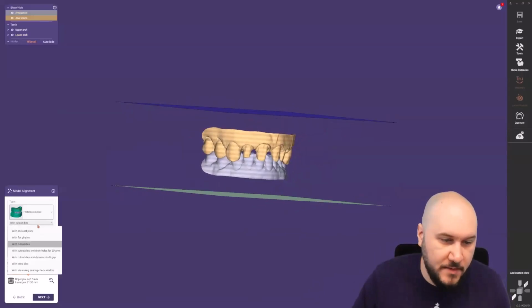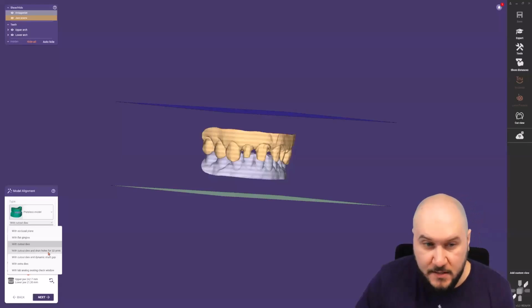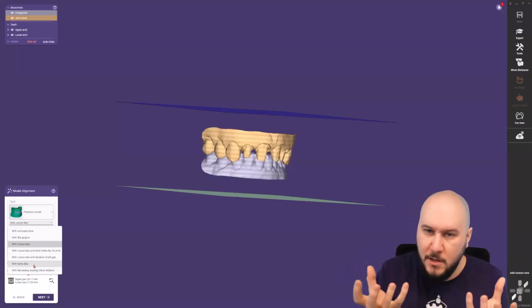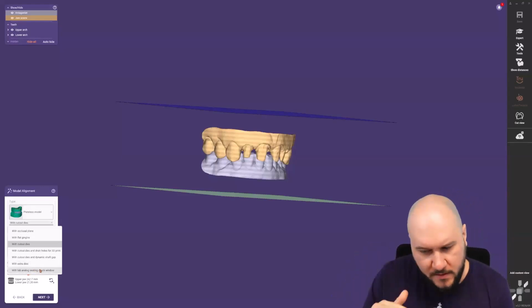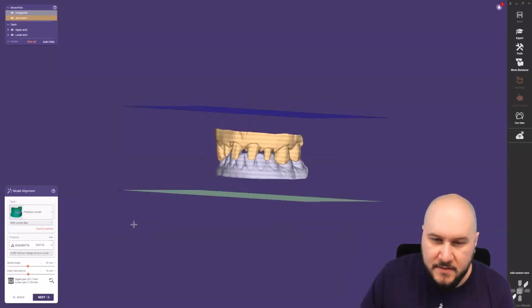And then with the small dropdown under the big type of model, plateless models, you can use whatever you want to. Also, if you want to have a flat gingiva or directly have preset drain holes, or want to make cutout dies with dynamic shaft gap, extra dies. So this means that you have the master model and the dies separate. Yeah, so you have one model where the stumps are directly integrated, and with extra dies, you will get the dies separated. Also lab analog seating window, but this will be for implants, so we will not cover that today.